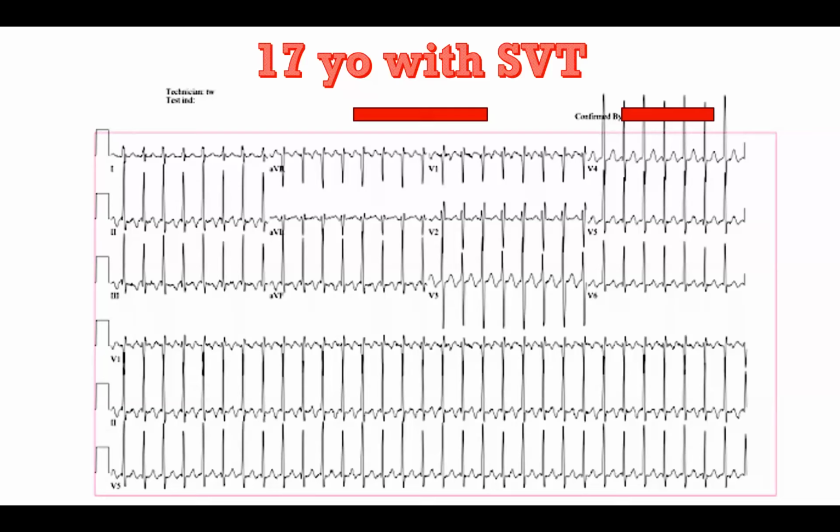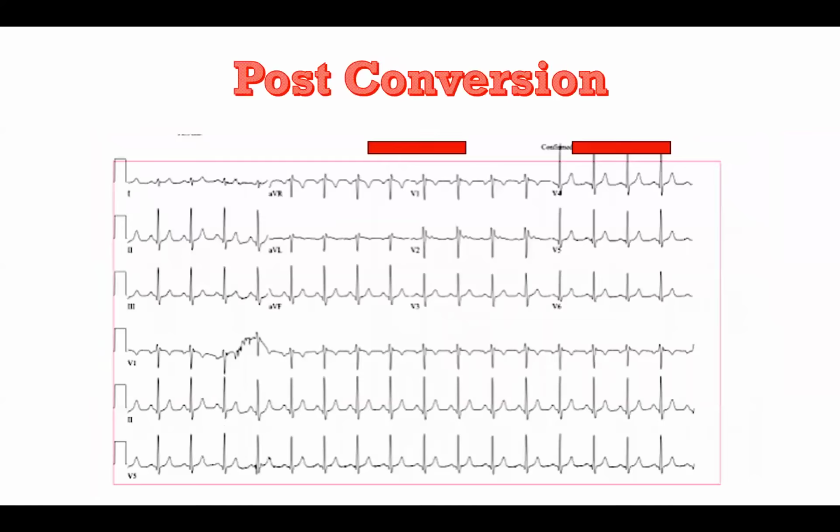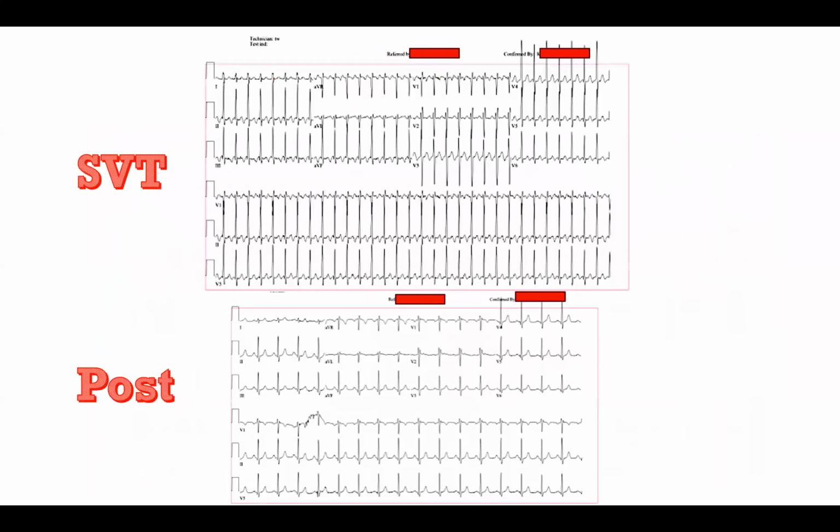The tachycardia did terminate. So this is the rhythm, and this is what the EKG looked like afterwards. Because I'm a nice person, I will show you both of them at the same time. So, anybody want to hazard some guesses regarding the mechanism of tachycardia?